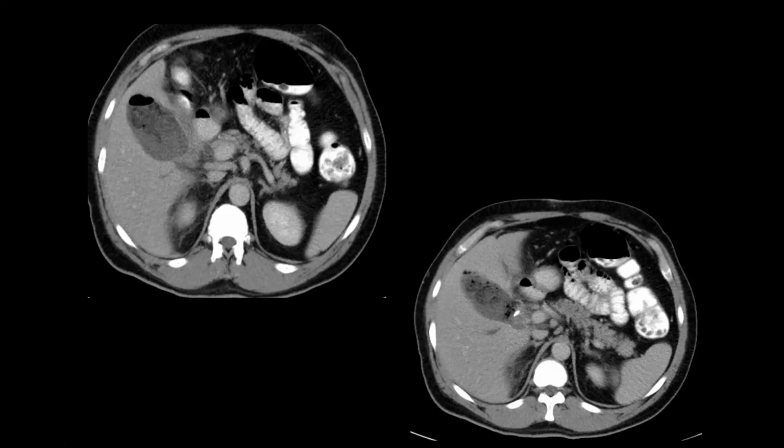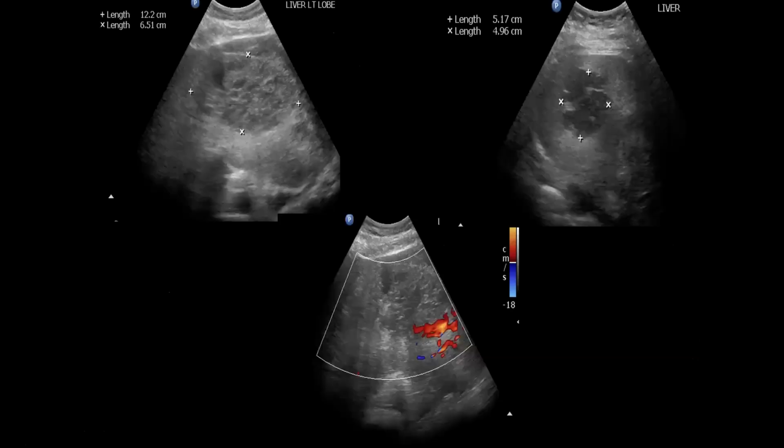This was called initially as an abscess because of the presence of a collection with gas, but when we dug into the history, we found that the surgeons used a hemostatic agent at the gallbladder fossa to control some bleeding, and sometimes that can lead to this appearance, which is mottled gas or feces-like appearance. One of the causes of right upper quadrant pain is also liver abscess.